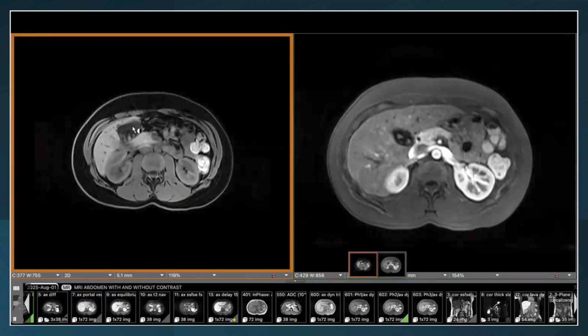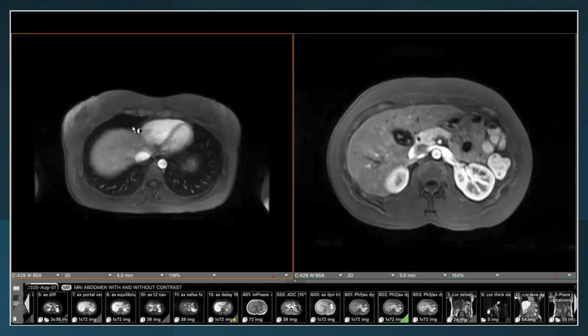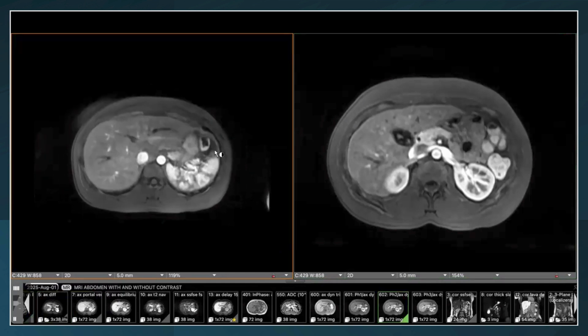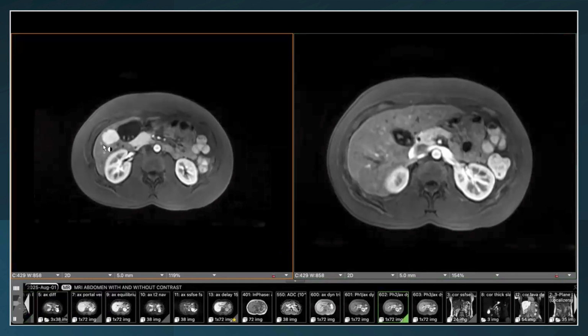Our arterial phase images are going to give us important information on whether or not this lesion is hypervascular against the adjacent background liver or hypovascular. As we move through the liver MR here on the arterial phase, you will note that this lesion is markedly hypervascular to the background liver. And so the combination of a stealthy lesion on T2 weighted images and a hypervascular lesion on the arterial phase images, especially with its lobulated contour, really has started driving me towards a diagnosis of focal nodular hyperplasia.